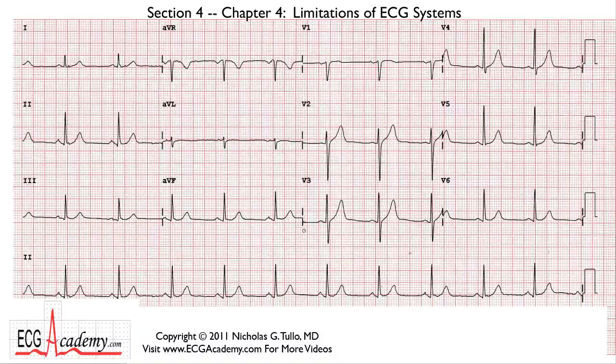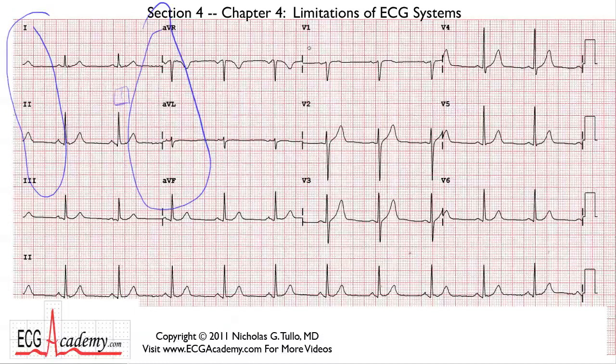And so here's the first 12 lead that I'm going to show you in this course. Hot off the presses from a brand new ECG machine, and it looks really pretty, doesn't it? There are nice clean signals, and what you're seeing is black ink printed on paper that has this printed pink grid. And just to get you oriented, you've got your limb leads, 1, 2, and 3, AVR, AVL, AVF, and then your chest leads or your precordial leads, V1 through V6.